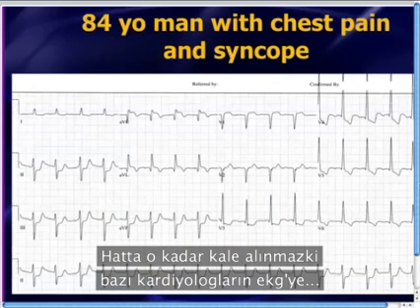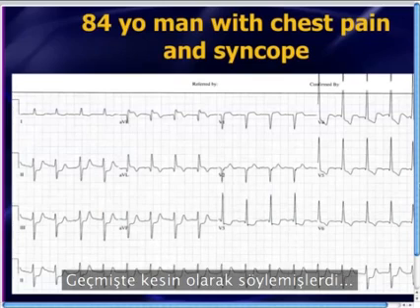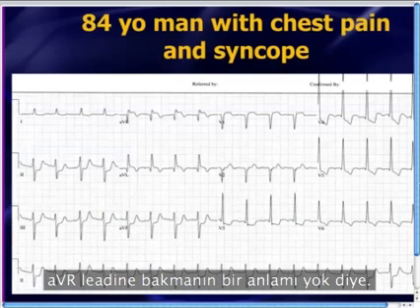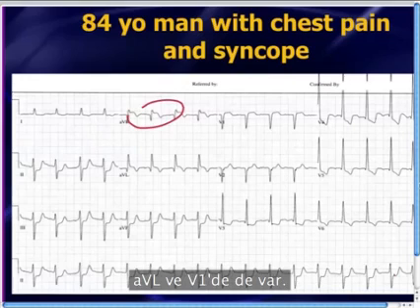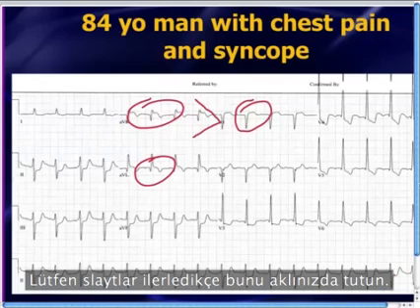In fact, it gets so little respect, I've heard some cardiologists refer to the EKG as the 11-lead EKG. They specifically have said in the past that there's no point in even taking a look at lead aVR. But if you do look here, you'll notice there's ST elevation in lead aVR. For purposes of upcoming discussion, you'll also notice that there's elevation in aVL and in V1, and the ST elevation in aVR is greater than in V1. So keep that in mind as we progress through these slides.